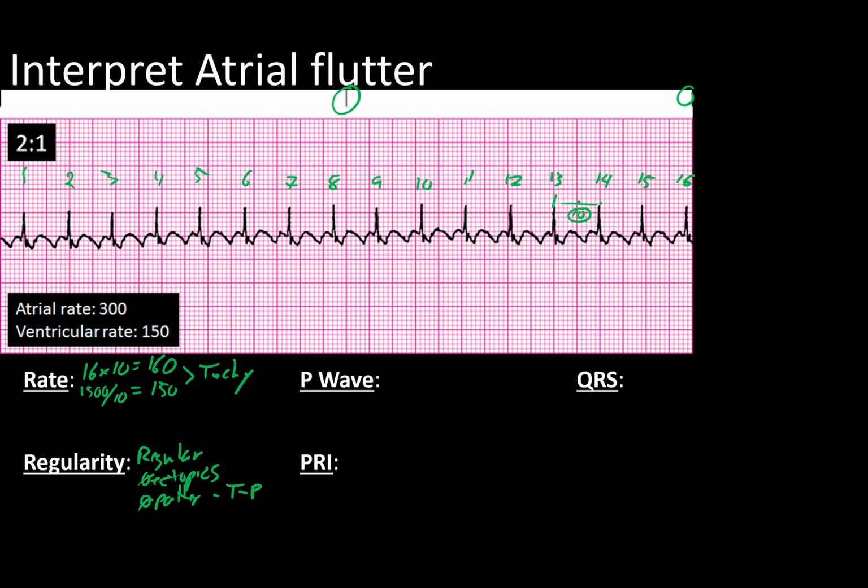Okay, so let's take a look at these P waves. If we do what we traditionally do and we look at that R wave, QRS, and look right in front of it, it looks like a mess. It looks like an inverted P wave. I don't know what to call that. It's kind of crazy. Well, just take a second to deconstruct it a little bit.